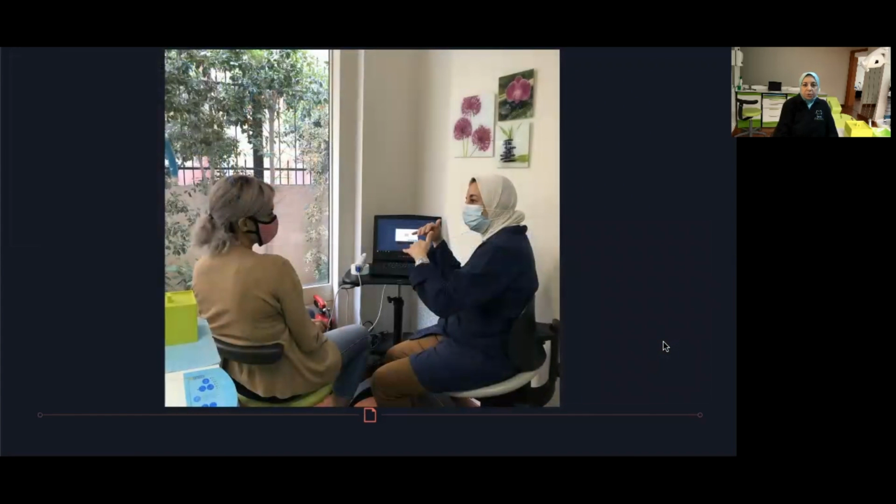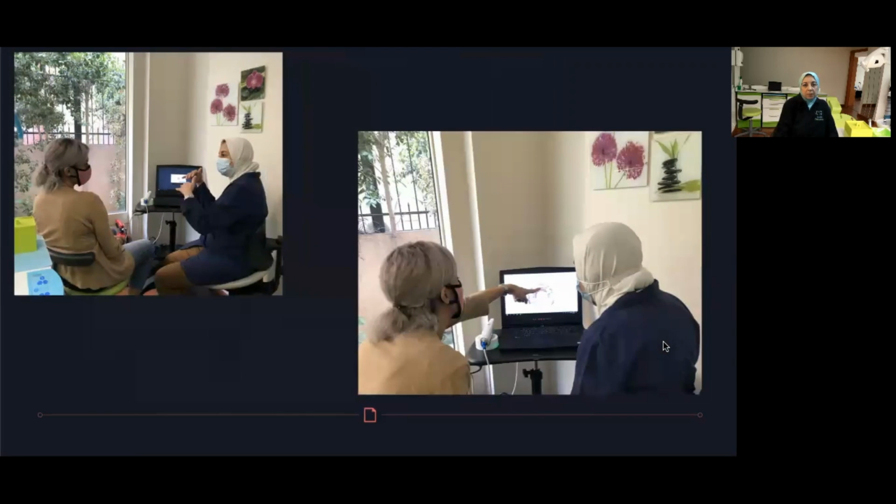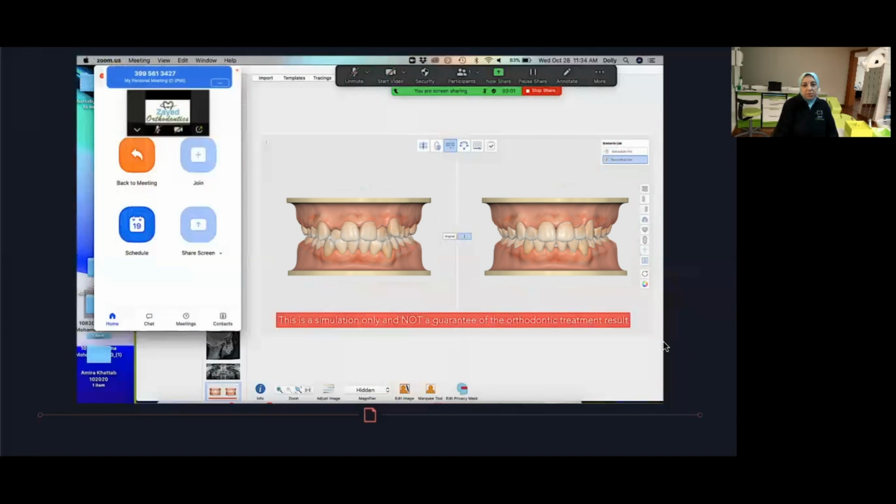The last step is showing all this to the patient. Rather than using handheld models to explain, the digital simulations make my consults easier and more effective. The patient is better informed and can be positively involved in decision-making. Using the simulation software, virtual consults can be as effective as office consults, with the patient comfortably watching my computer screen from home, along with family members.